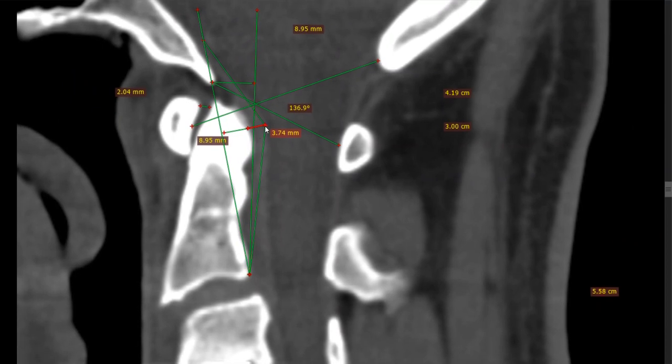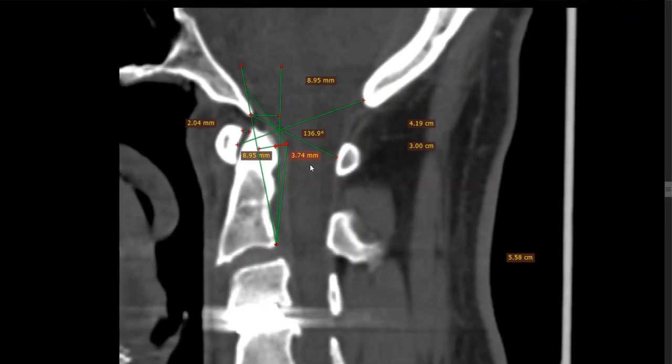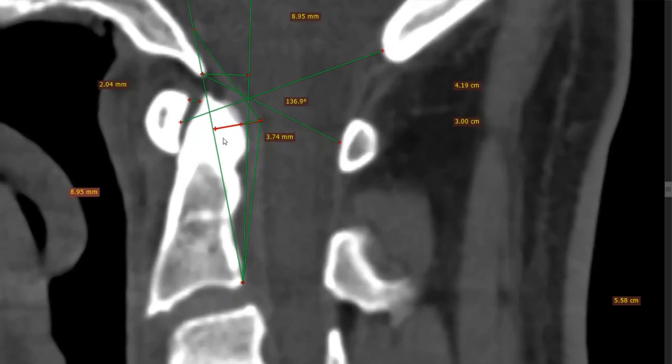There is nothing that says what's pathological in regards to this, but that is pretty thick. An MRI will reveal this a lot clearer, and so that would be the next thing to get done. All right, and the final one, which is nothing major because I can already see that it's not a problem. Bring this guy there, and this is the BDI, which also needs to be under 10.